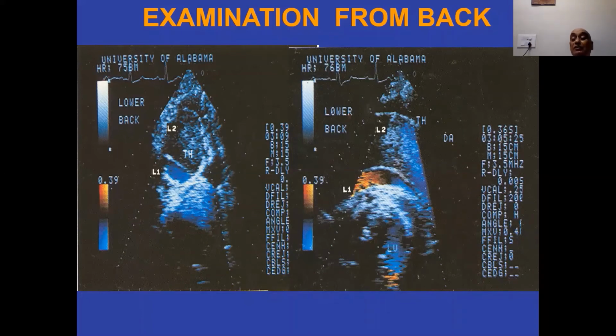So I've gone over all the views that are available, and many of them are unconventional views, which you do not normally find in many of the textbooks, but I think you should always have them in your armamentarium. They may not be in the guidelines of many of these recommendations, but most of the time you should be able to utilize these views, and if you keep in touch with these views, that's very important. Thank you very much.